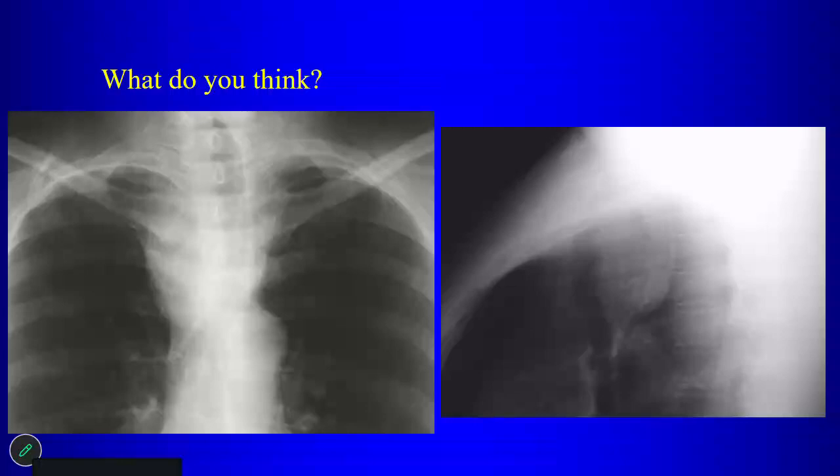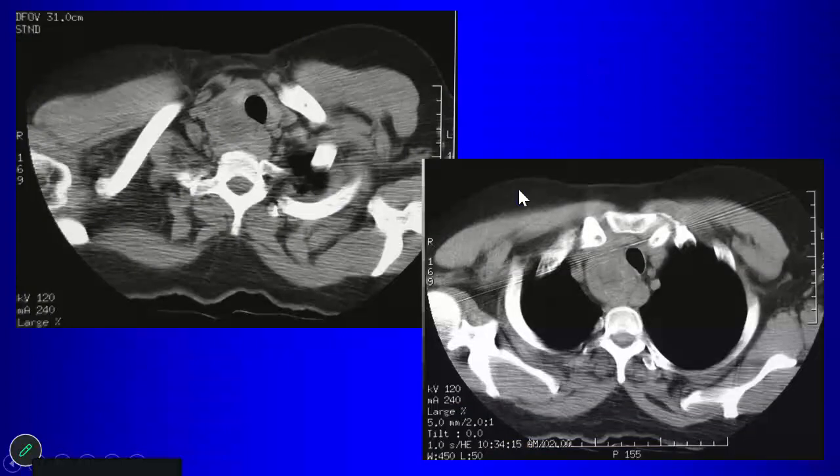Okay, so why do you think it's thyroid? Because again, it looks like we have the cervicothoracic sign, so it's coming up from. The most important feature that points to this being thyroid is what? Deviation of the trachea. Again, you have a mass that's coming down from the neck, right? Again, the cervicothoracic sign there, but it's coming down from the neck and it's deviating the trachea. Whenever you see that, you think thyroid mass first, even though it's extending there to the middle mediastinum.